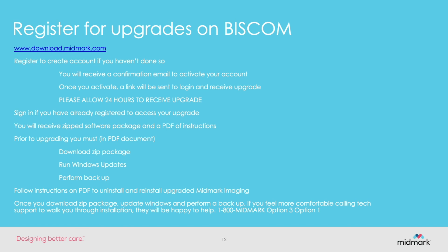Once you do that, you will receive a confirmation email to activate your account. And once you activate that account, within 24 hours, you will receive a link to log in and receive your upgrade. Please allow for up to 24 hours to receive that upgrade. In most cases, it's much less than 24 hours, but give it 24 hours.